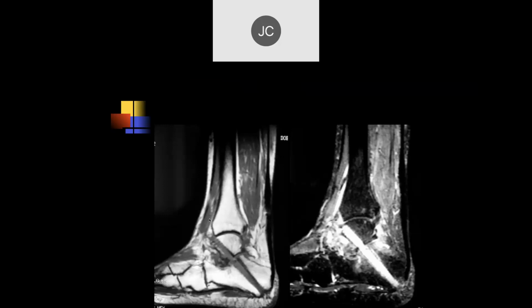All right. So it looks like a posterior calcaneal screw, like a calcaneal talar fusion. What happened here is they put this in to fuse it. The patient developed pain, so they had to remove the hardware, and then they were left with this large defect from the hardware. You can see some bone edema here, but without clear-cut bony fusion involving the subtalar joint, and that was a failed fusion.